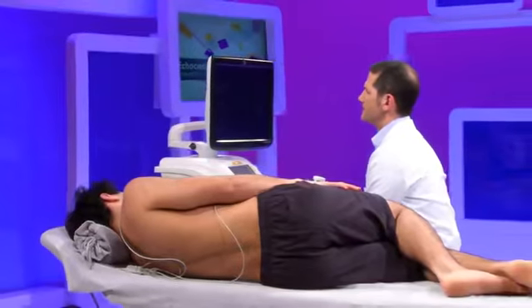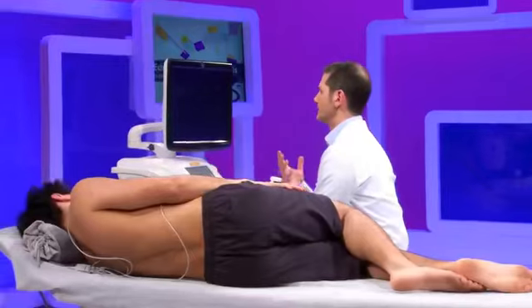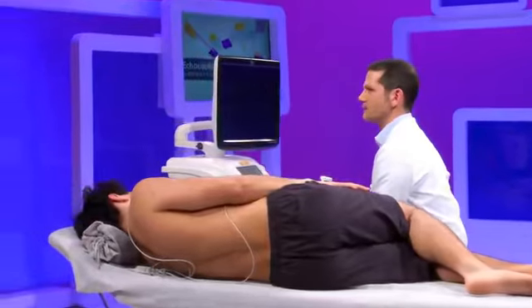However, there is still a problem with this parameter, because whenever the value of this ratio is below 8, the pressures are likely to be normal. When the ratio is above 15, the filling pressures are most likely elevated. But in a broad range between 8 and 15, there is a gray area where we cannot really say something reliably about the level of filling pressures. And it is in that particular area that we need additional information to add on top of that if we are to figure out the level of filling pressures.